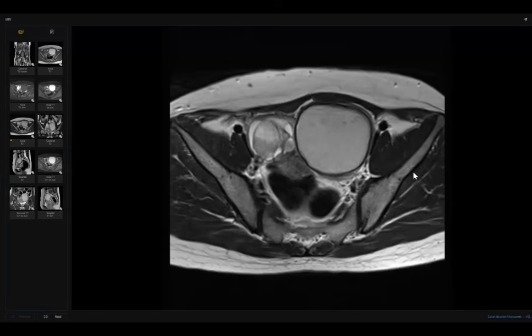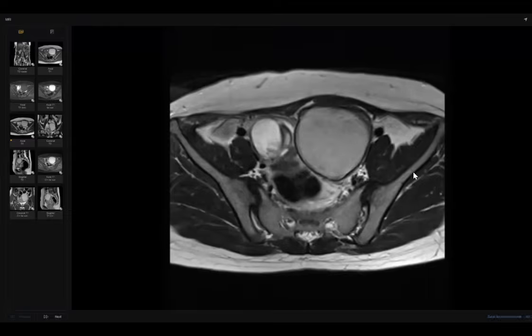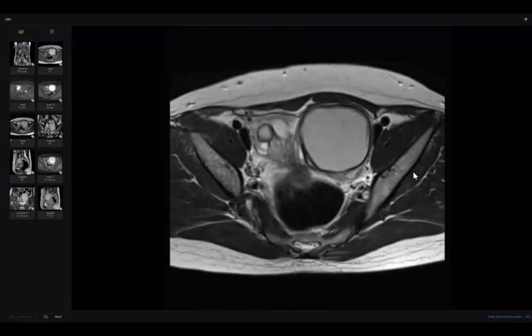One of the golden words: don't trust the examiner when he gives you something very clear. Yes. Correct? Don't trust me, please. Okay, so I would now again review my findings. I would like to see any other endometriomas, endometrial deposits in the pelvis.